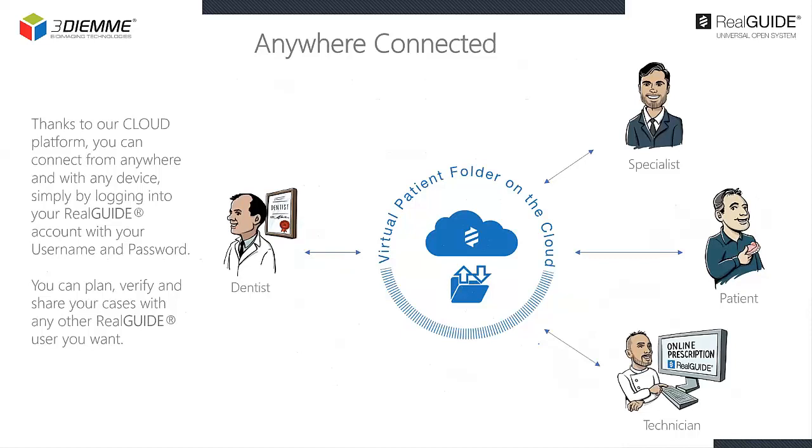Furthermore, it's possible to plan, make changes, and share cases with any Real Guide user you want: colleagues, dental technicians, production centers for the manufacturing of the surgical guides, specialists, for example radiologists, and why not even with your patients.